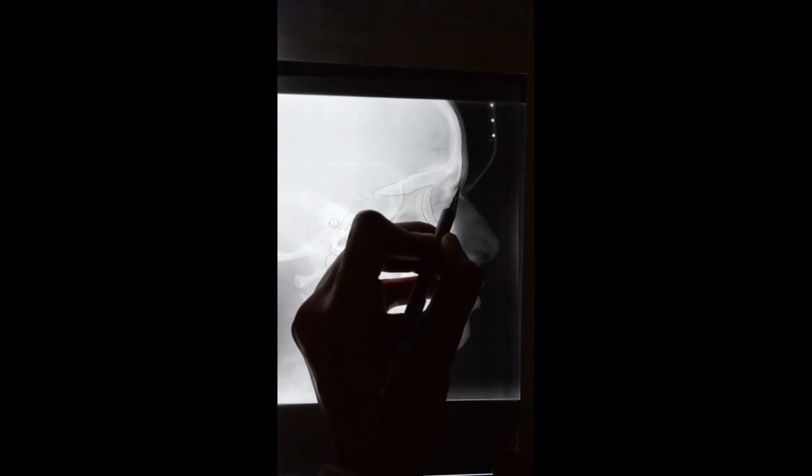You have the nasal bone here and we have the frontal bone over here. If you can see this faint radiolucency over here, this demarcation is basically the nasion point. And the most anterior point of the suture is going to be the point nasion.